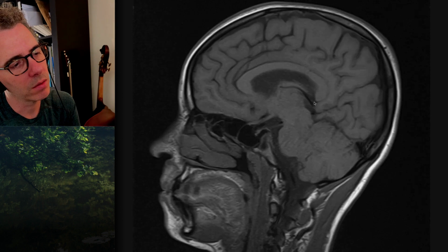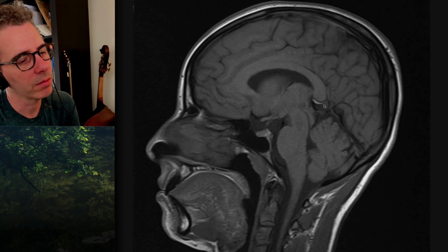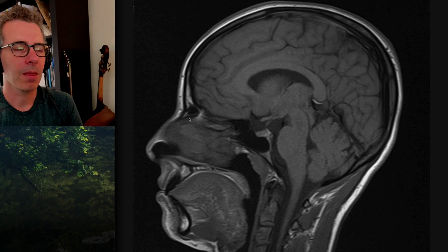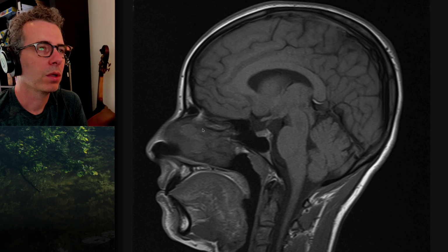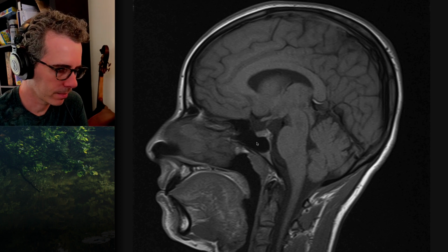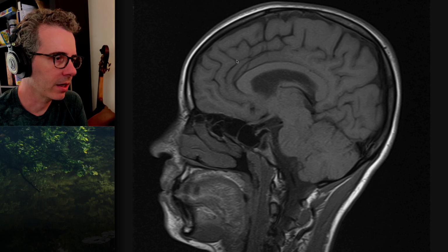I saw that. What did you think? What do you think I thought this was before I looked at it more carefully? A lipoma. What sort of lipoma? Interhemispheric lipoma. Yes. But the corpus callosum looks normal. So what types of pericallosal lipomas do you know? There is the tubulonodular. Which is where and what's it associated with? Corpus callosal agenesis. Yeah, and it's usually anterior.